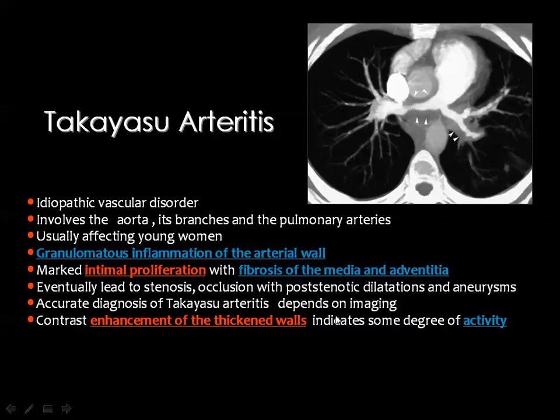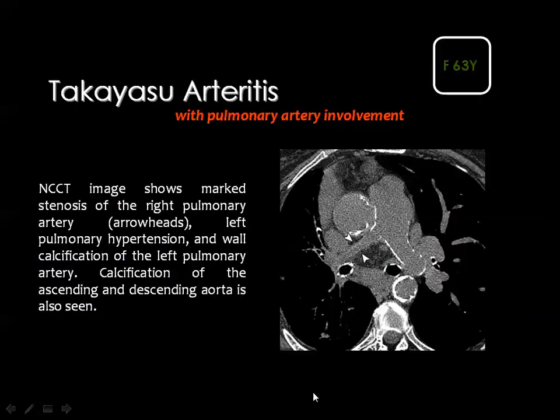And if you give intravenous contrast material and you get enhancement of the thickened wall, this may indicate that the disease is in its active stage. And this is the non-contrast CT scan of the mediastinum, showing some calcium in the wall of the aorta and the wall of the pulmonary artery.